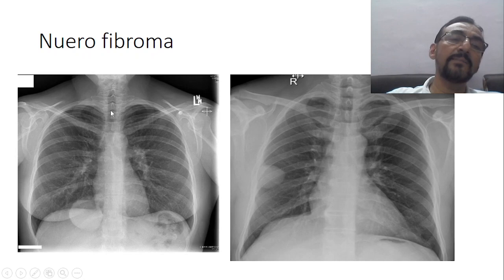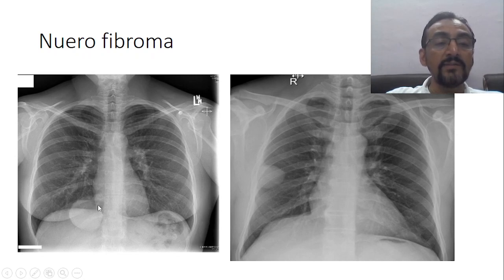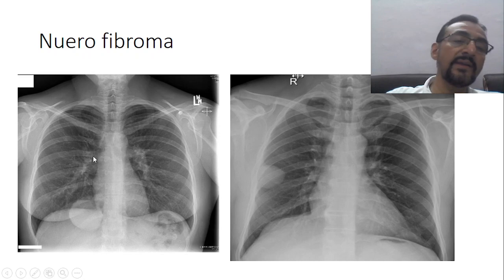Yes, this is centrally placed. The trachea is there, centrally placed. See, the trachea is divided. This is the carina portion, and this is the right bronchus. See, this is the left bronchus over here, and this is the ascending aorta, and this is the right atrium. Okay, so superior vena cava, inferior vena cava, everything is fine over here. The hilum is correct. The hilum is not exaggerated, okay.